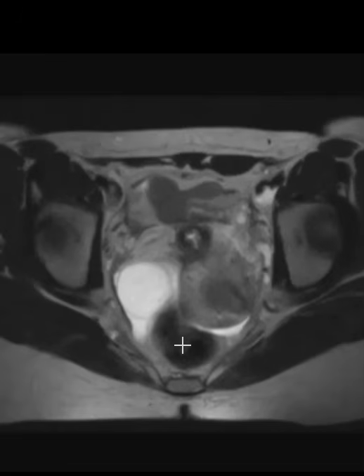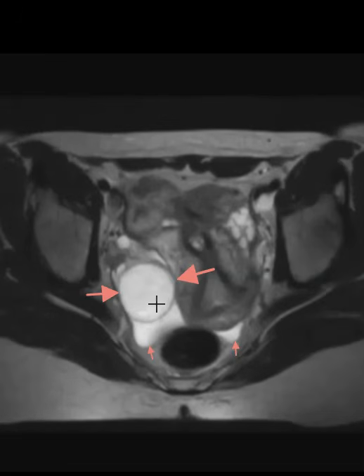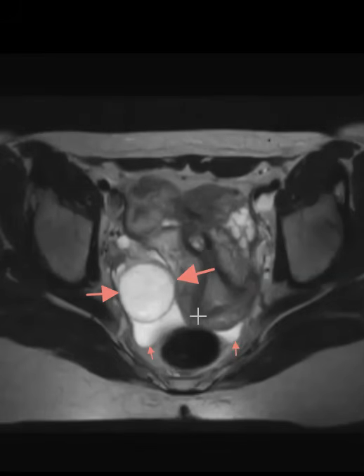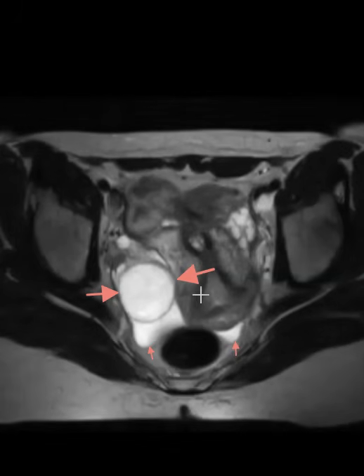This is her rectum right here, so it does touch the rectum, and there's leaking fluid. Here's the cyst, and the other small arrows point to a little bit of leaking fluid, so the leaking fluid surrounding the rectum. So we imagine that the ovarian cyst, because of the mass effect and leaking fluid, is causing the symptoms related to the rectum. But a very common finding here, and again, hers is just in an unusual position, low and back, and probably causing her symptoms.